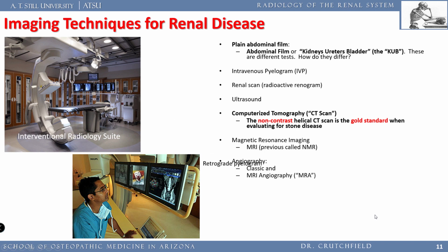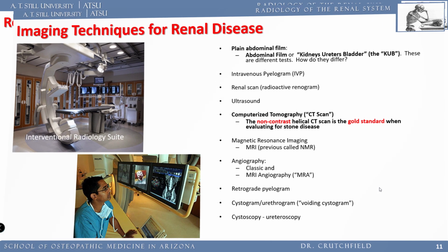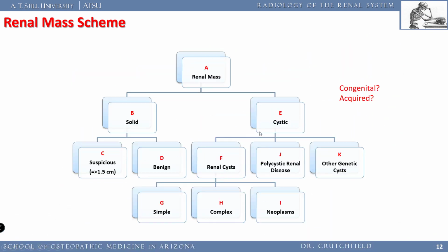What's MR? How is MRI useful? How is a classic angiography and MRA useful? And we're going to look at all of these things. We're going to look at a cystogram, a urethrogram, retrograde pyelogram. We're going to look inside a bladder using the cystoscope.